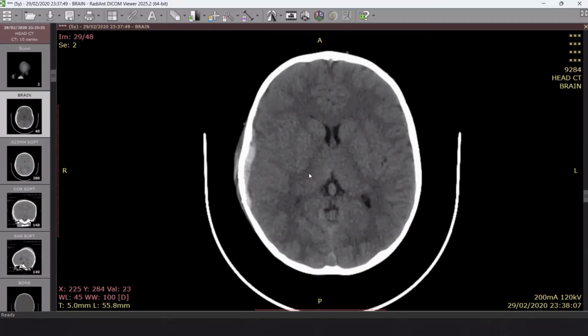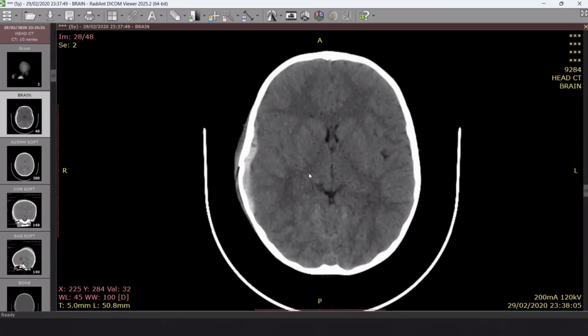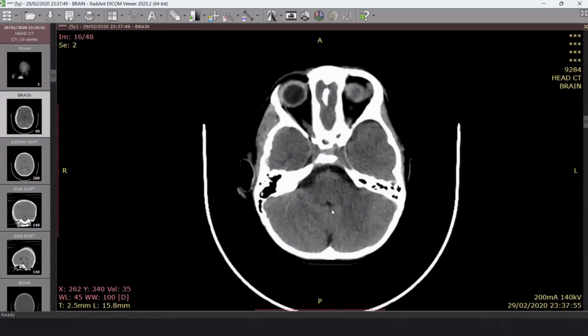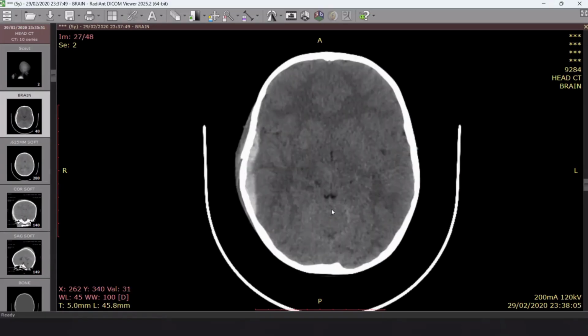Okay. Candidate number 2. Trauma case. If you want to scroll. Yes, I want to, sir. Yeah. I'll request control. Yes, go on. Sir, okay. I'm scrolling now.